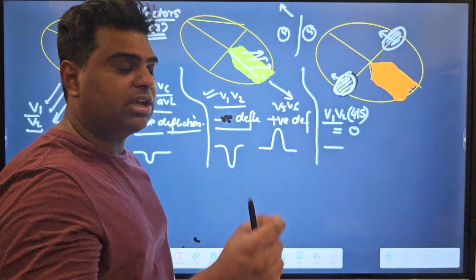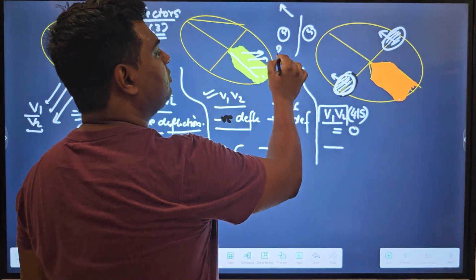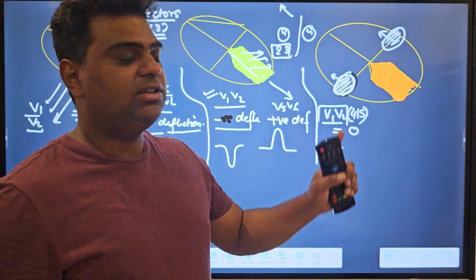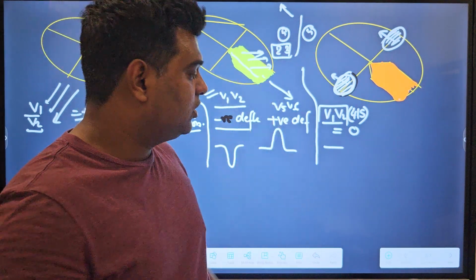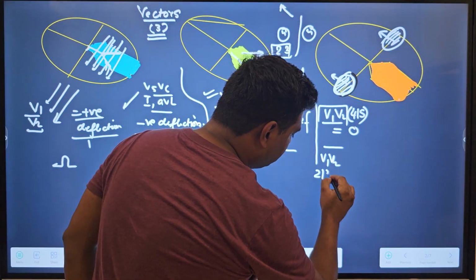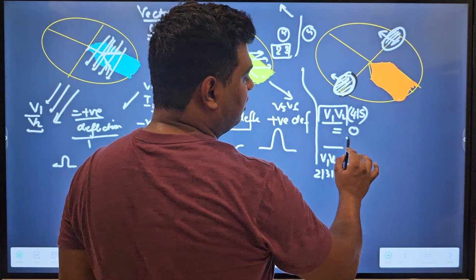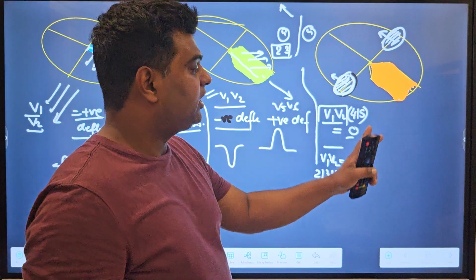If by chance a technician puts the V1, V2 lead in the second or third intercostal space, then this depolarization is not beyond the scope of V1, V2, and they will record this depolarization wave. So for example, if V1, V2 are kept in the second or the third intercostal space, they will record a positive deflection like this. Otherwise they will not. Second, the wave is very fast.